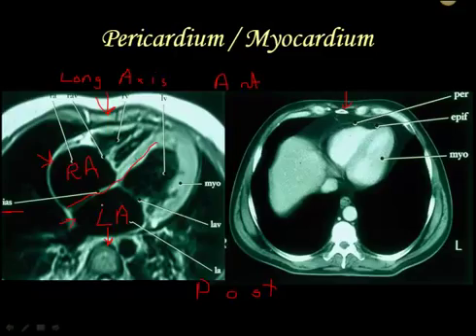They both look huge. A big part of the reason why they look huge is this is not a straight axial. Remember, this is at an angle, so it tends to exaggerate them a little bit. The other thing is you would expect that at some points both atria are going to be wide open prior to contraction of the heart, and it seems reasonable that's kind of what we're looking at here.